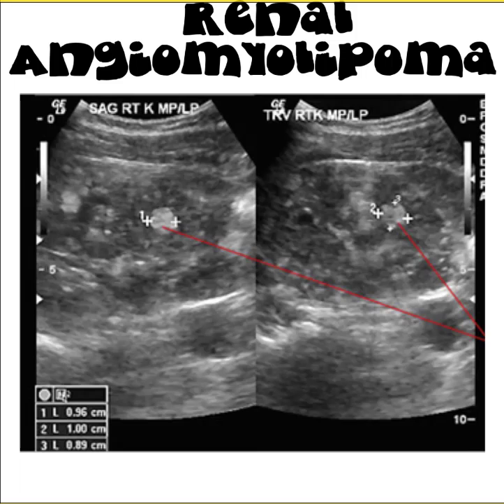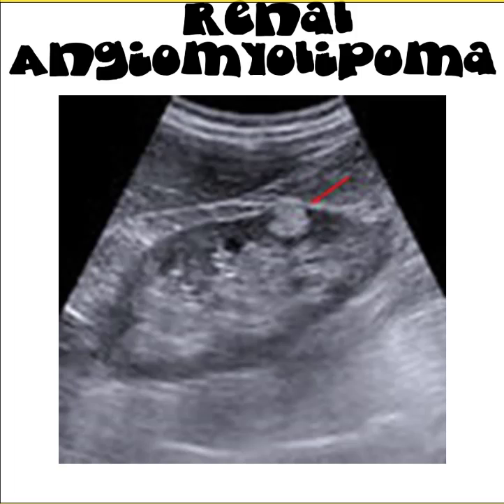So here's an example of an angiomyolipoma. Again, very bright, no shadowing, no vascularity, usually found in the cortex of the kidney. Here's another example of an angiomyolipoma. They usually are relatively obvious, especially when they are surrounded by the more hypoechoic cortex of the kidney.